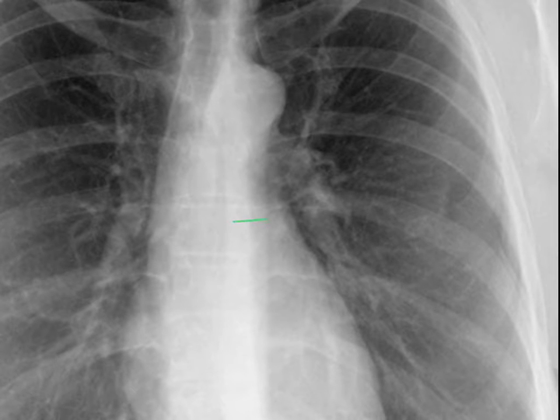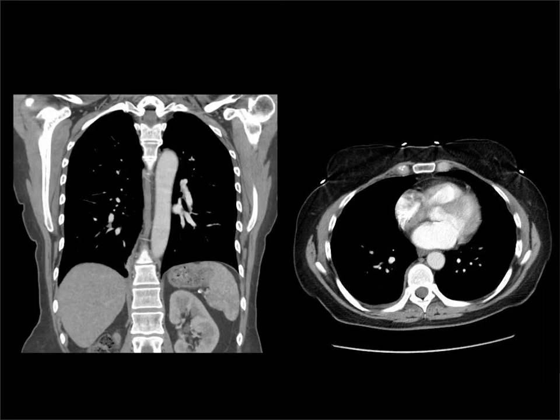Here on a zoomed image, it's that line there. And just to show you on the axial CT, you have the lung on the right coming in, it's against the esophagus and the azygos vein, and that interface there with an X-ray beam coming from the front is going to make the azygoesophageal line.